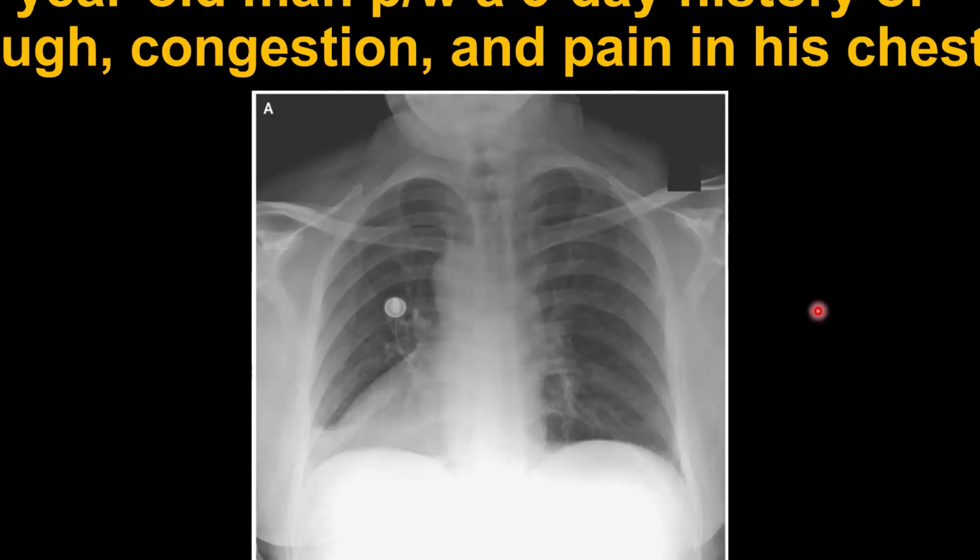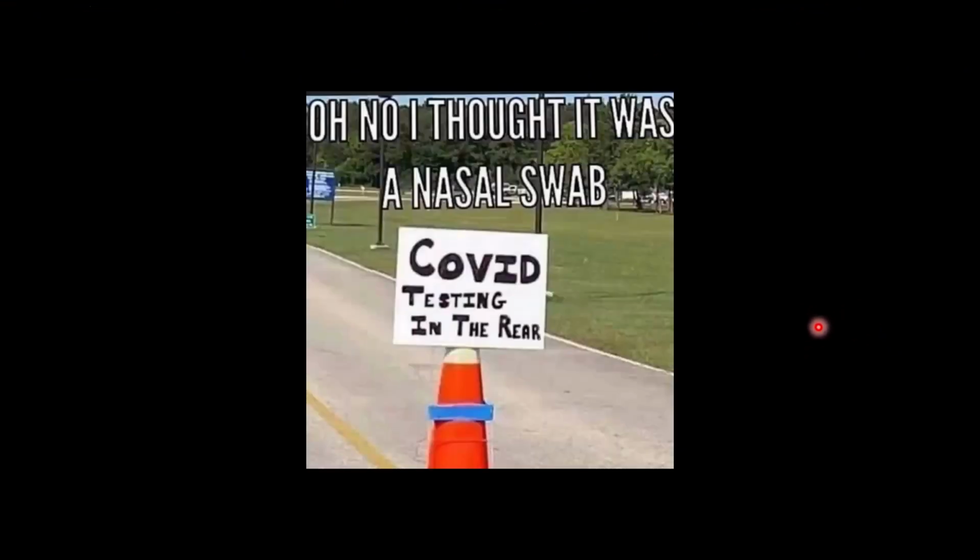So here's our zebra for today. Okay, dextrocardia. And in fact, I think we've come to the end of our time. And so this is my parting shot right there.